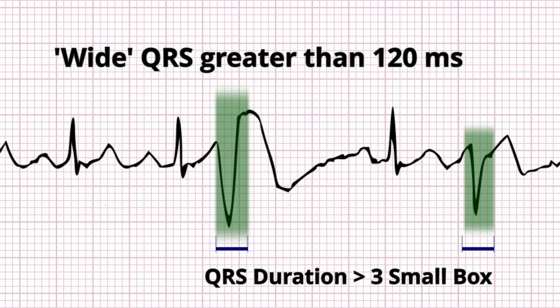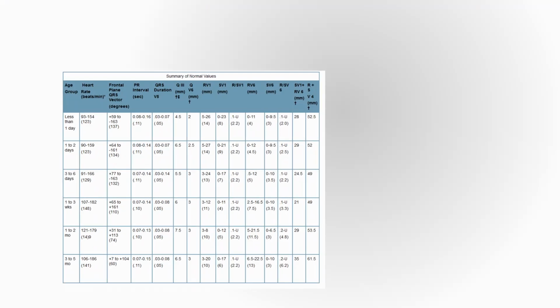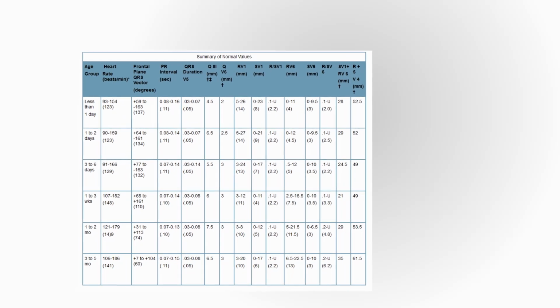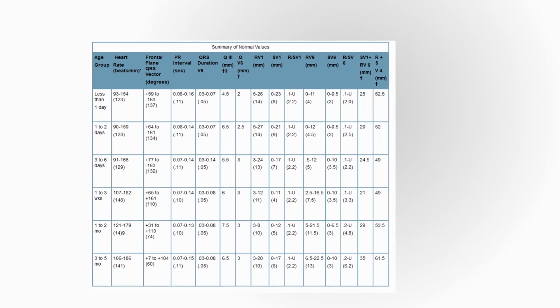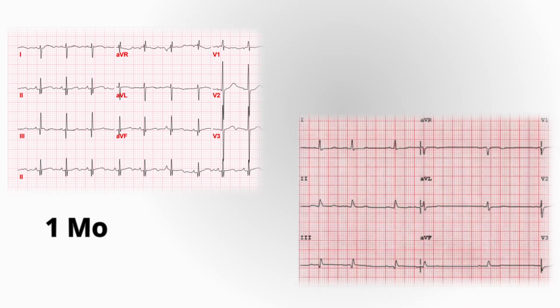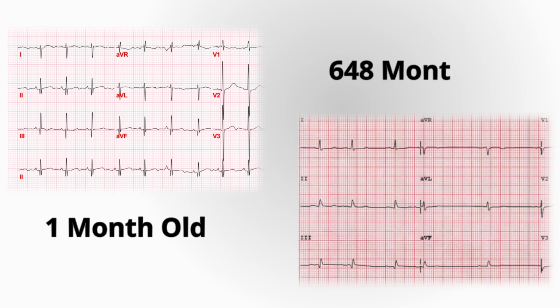And this is a sign of a problem within the ventricles themselves. It's taking energy too long to move within them. Any numbers I'm giving you today are reference values for adults. Children have physically smaller and electrically more efficient hearts than adults do, so all of these intervals are going to be narrower. Eventually, you should be able to know that it's a child's EKG just by a fast glance. The most specific clue, in my opinion, is narrow QRS complexes.